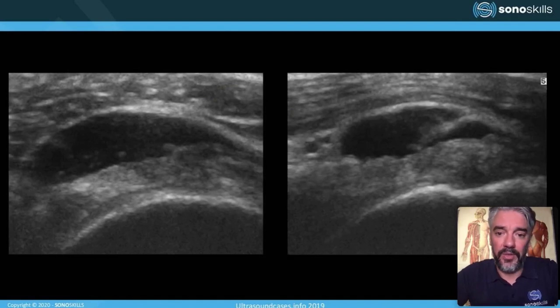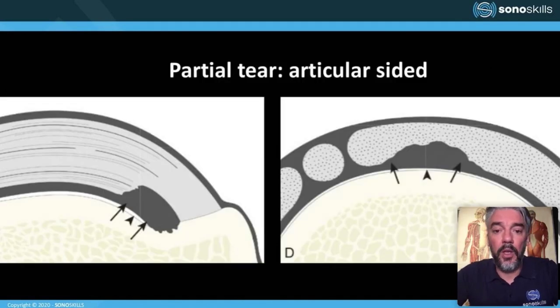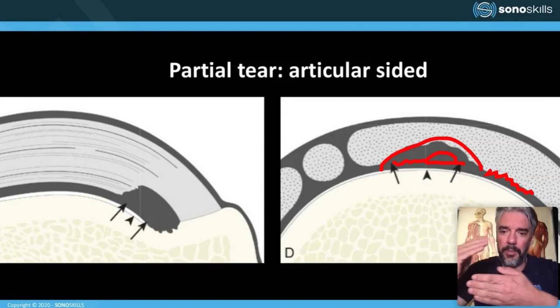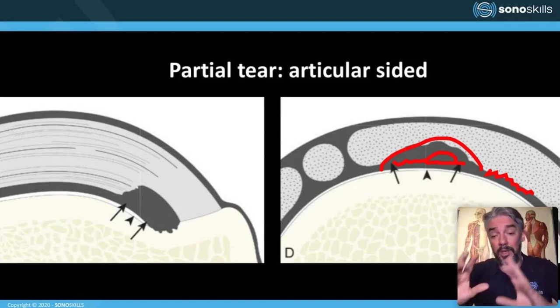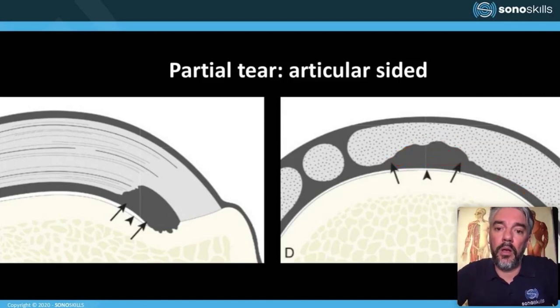And these are also examples of bursal tears. So the articular sided tear is close to the bone, and we know that because the hyaline cartilage is anechoic, and we have an anechoic zone anyway there, and then also a tear. If the tear is small, it's very hard because anechoic hyaline cartilage and anechoic tearing might overlap. You might miss it, so look closely at this zone.